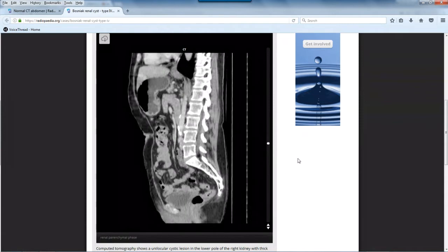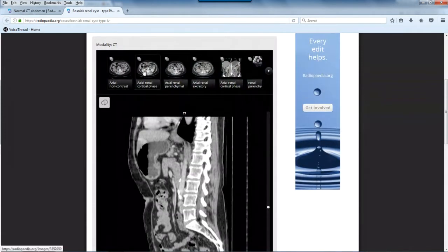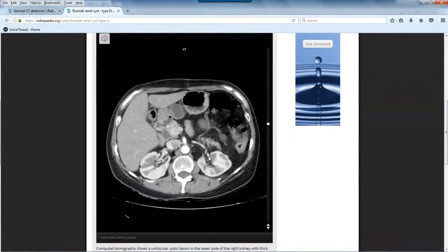Okay, so that's the easiest way to see the three main unbranched vessels coming off the anterior portion of the aorta. All right, so let's go back and look at the axial just so we can see the renals. We haven't looked at the renal arteries yet.